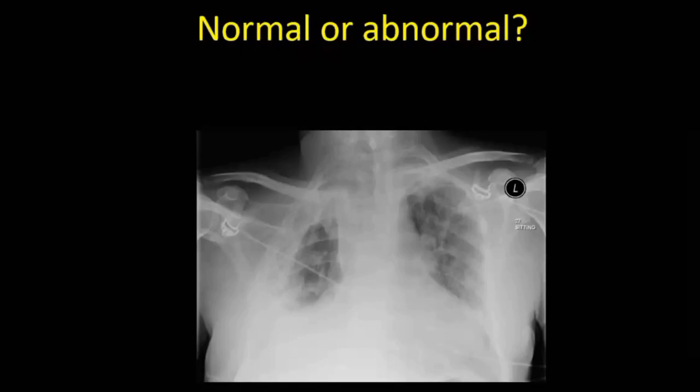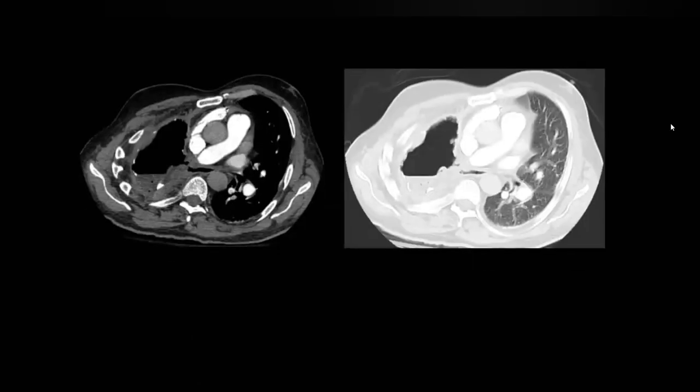Okay, so now we move to the CT scan. Right. So I'm provided with two images of CT chest with IV contrast, axial view. The patient had pneumonectomy just for TB, not for malignancy. Okay, fine. So I can appreciate that there is a large cavitating area and there is development of an air fluid level within it. In fact, the air fluid level within it is also having specks of air in it.